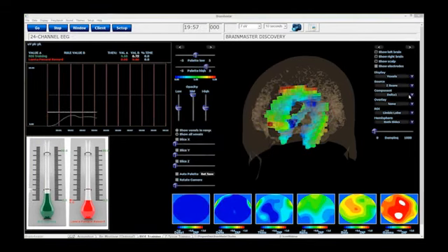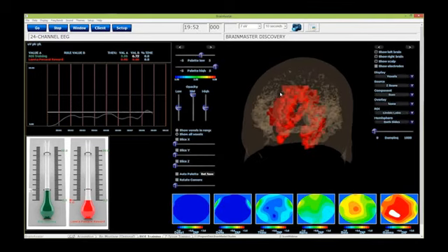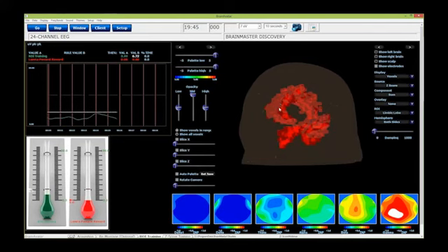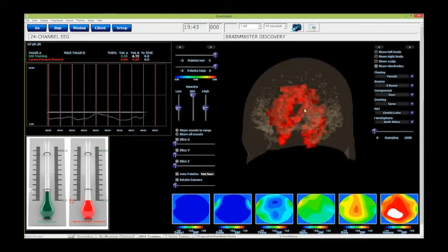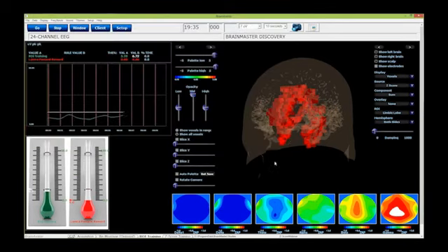All right, so let's have a look. No, it's coming in. As I said, this number is very, very high, and that's one of the reasons I don't really use it as a metric. Z-score sum, if I go back to my Z-score screen, I don't have sum checked on here. So the number is coming in, I just don't have it being displayed. So I'm not sure exactly what happened on that, Debbie. What you may need to do is call in over here, and we might need to take a look at it to see what's going on exactly.